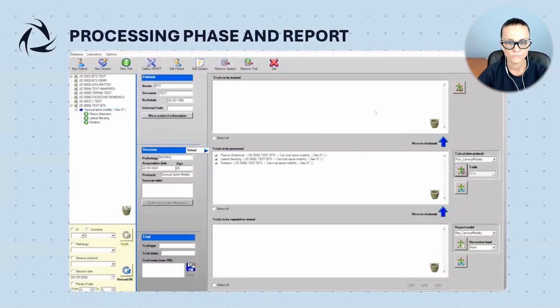Okay, now the trials are ready to be elaborated. So this new video will explain how to process the trials. During the elaboration, many mathematical functions will be used to extract all the clinical indexes, graphs, and parameters for the complete evaluation of the patient.